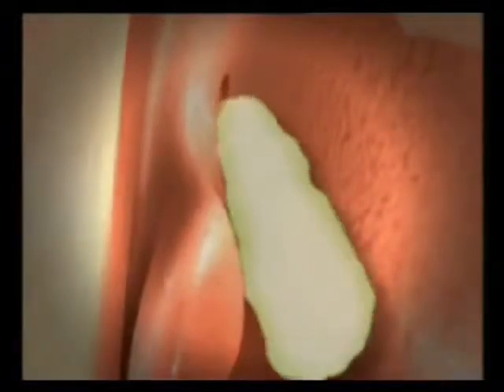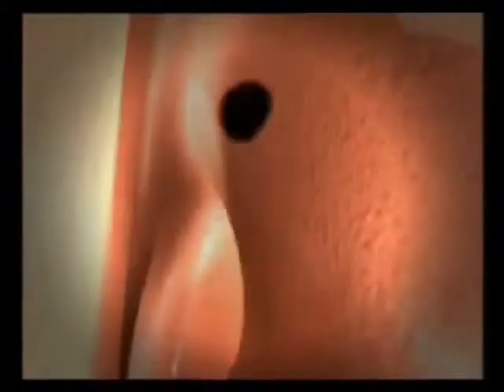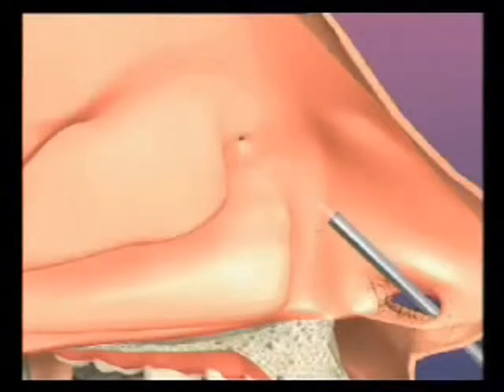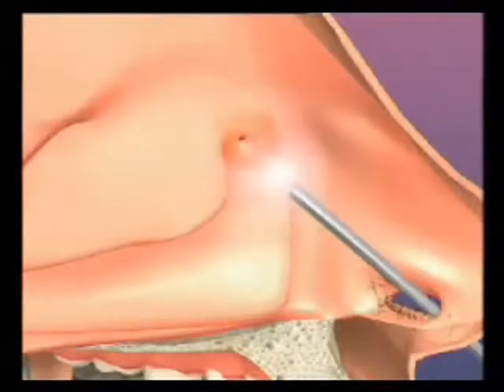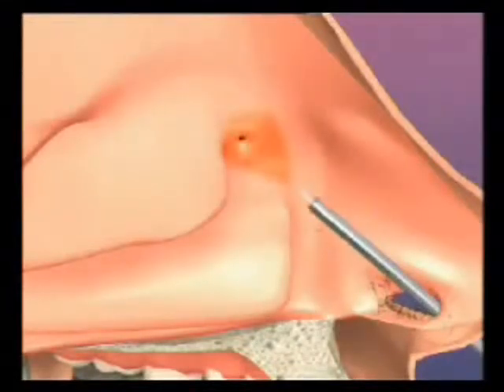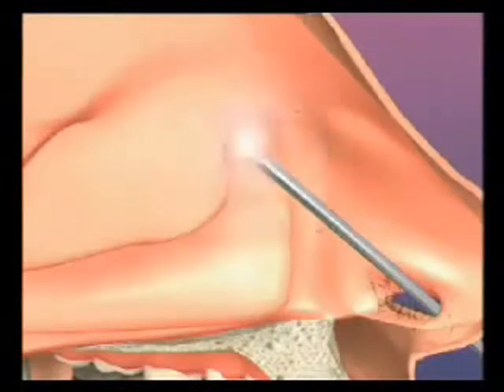Under direct endoscopic visualization, the initial osteotomy is expanded by transcanalicular route in the antero-inferior direction by juxtaposition of converging bursts in the form of a circle. Another option is to expand the initial osteotomy by the endonasal route. The nasal mucosa is first coagulated with continuous mode laser energy and no contact. Then antero-inferior excision of the bone tissue in the ascending apophysis of the upper maxilla is performed with the laser in contact mode and pulses.